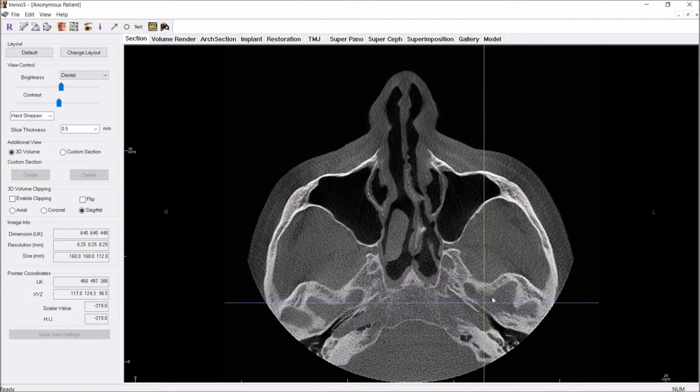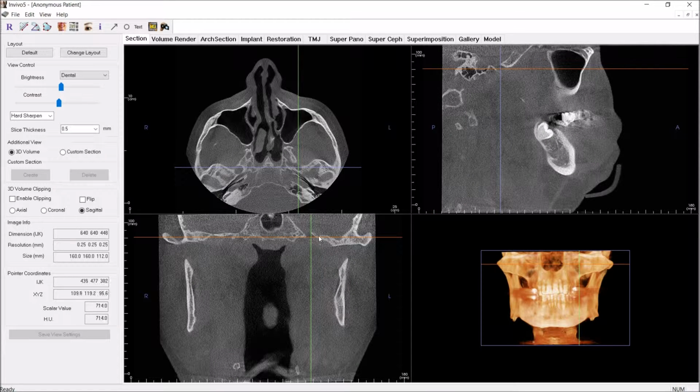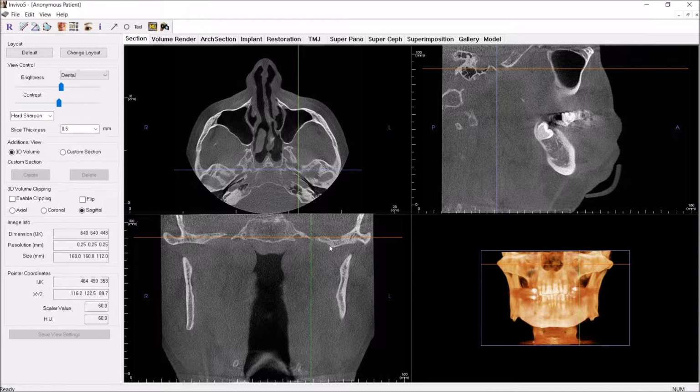Let's go through some more of the normal anatomy. I see another hole kind of opening up here, another foramen, and that's bilateral. That's normal anatomy. You may know already what that is. That's the Foramen Ovale. And again, look in other planes. It's clear that that's a foramen, and it's the Foramen Ovale. Let's scroll this back a little bit, and there you see it on the opposite side. So bilateral, symmetric, normal anatomy.